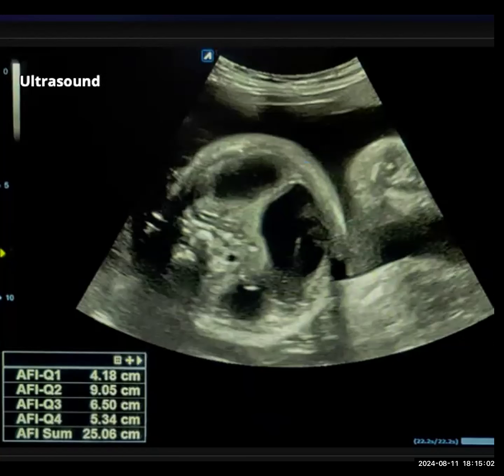Last 5 minutes. And these calcific structures could be lymph nodes or segmental vertebral anomalies. What would you like to do next?